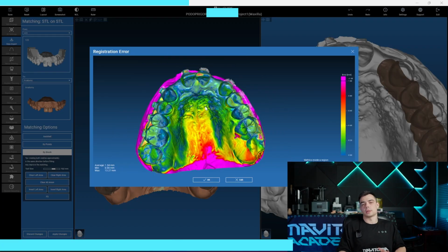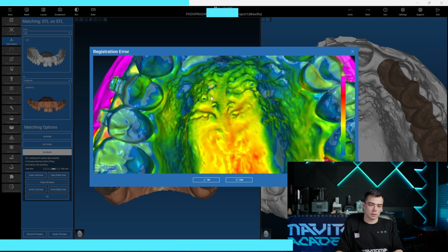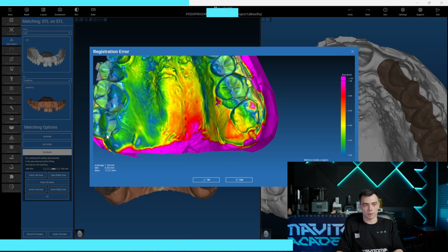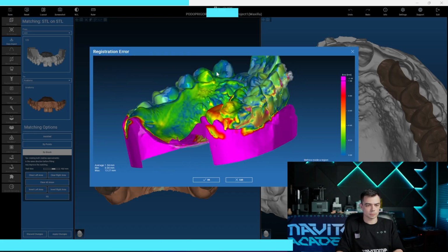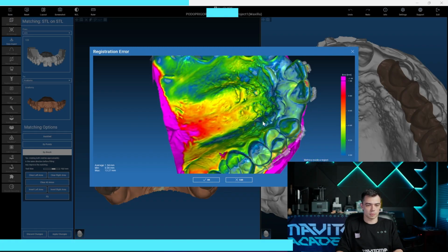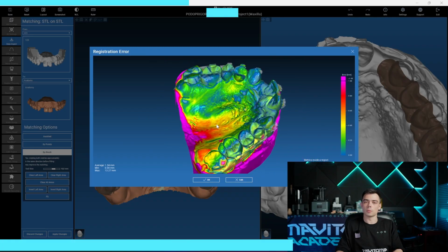We are not even taking into account the malposition of the teeth because of the time, because of the 2 weeks time gap between the impressions and scans being taken. Yeah, but let's also take a look at the distal area of the scans and model, and we see the difference of the shape of the tissues is significant. What does it mean?